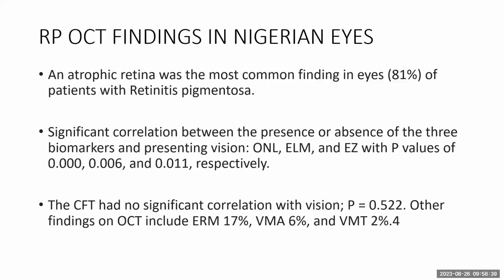So if you're monitoring a patient with RP, you should have an OCT, and it's your basis for prognosis and for counseling. Now, when you monitor, say vision is 6/9 in daytime and you have an OCT where the lines are there, and 2 years down the line you repeat the OCT and the lines are beginning to reduce, they will shrink before they disappear.